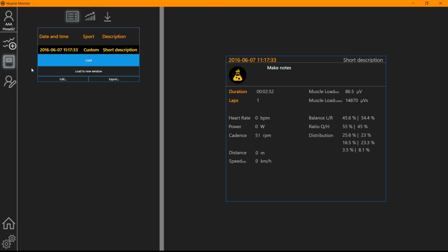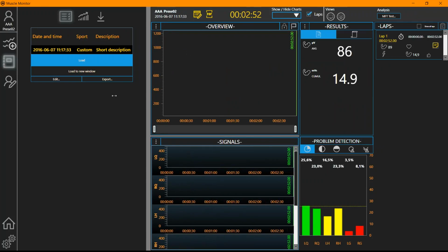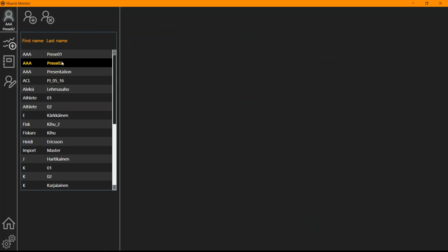I can show you with another data we already have made previously, because this was just simple noise, so this isn't a good data.